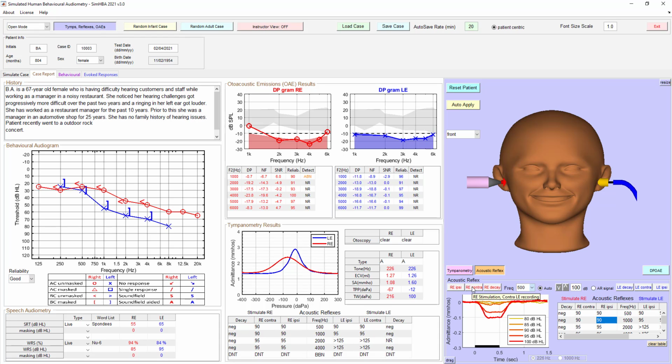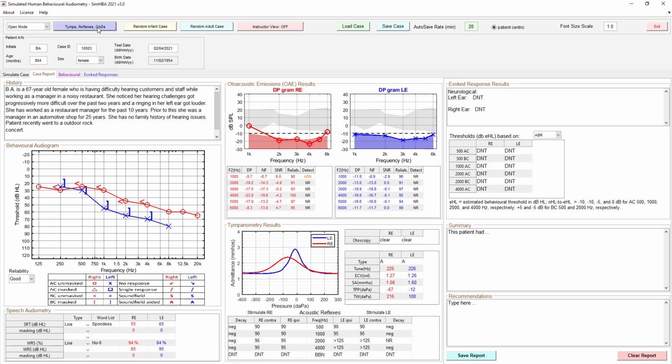This will also do contralateral recordings, so right ear stimulation, contra left recording, as well as right ear contra decay. So you can look at the decay functions, and also that for the right and left. And underneath, what you can do here, this is the AR signal. What this shows is if we did do the testing, whether or not, like we thought that there was one here at 90, and yes, you can see in green line that their true response reflex was present. Let's close out of that and show you the rest of the case report.